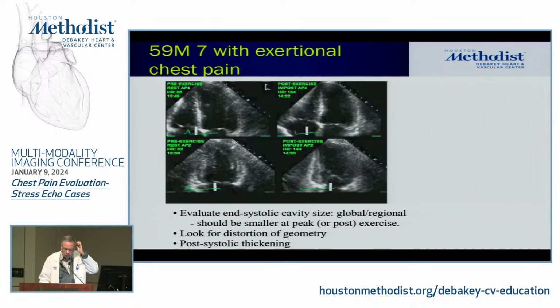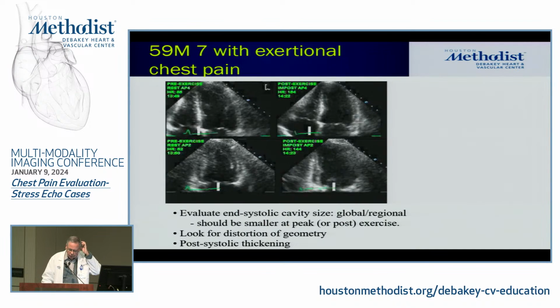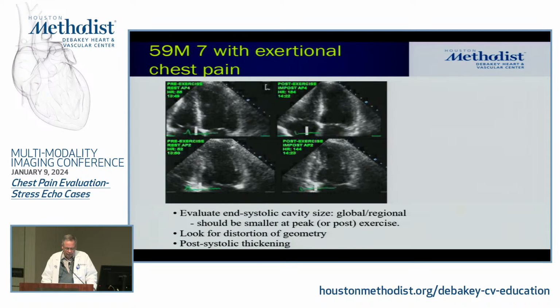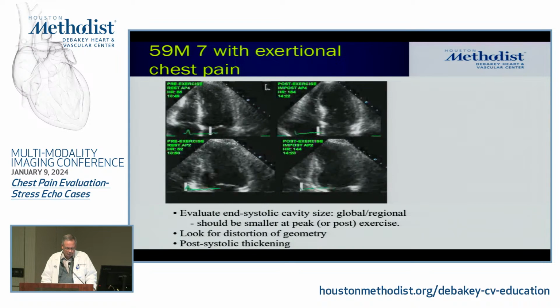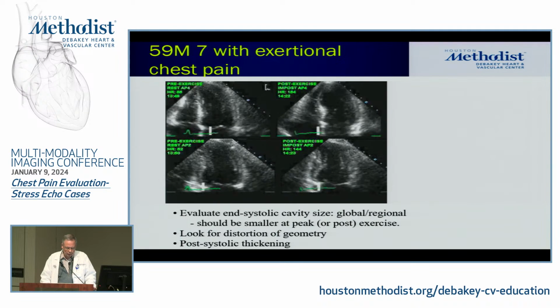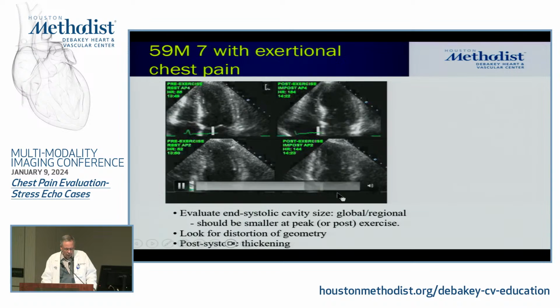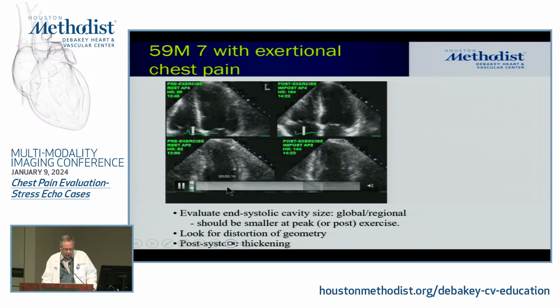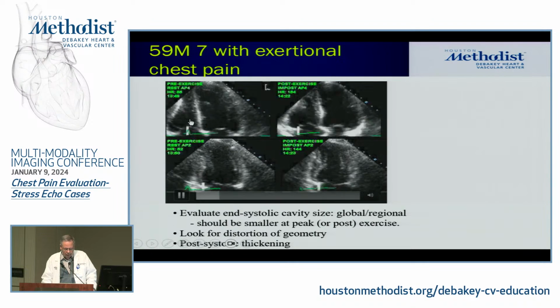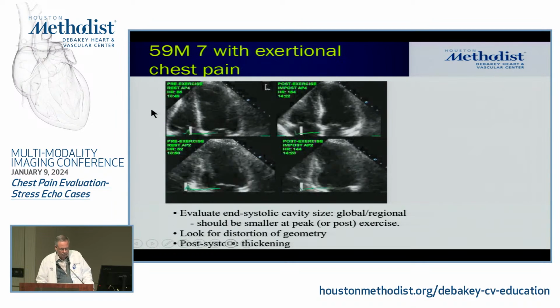So this is a patient with chest pain. So what do you all think? Is this a normal stress test? We're doing 4-chamber and 2-chamber. So we have pretty much the four territories, but the LAD is going to be here because this part here is part inferior wall. So I owe you the parasternal views.